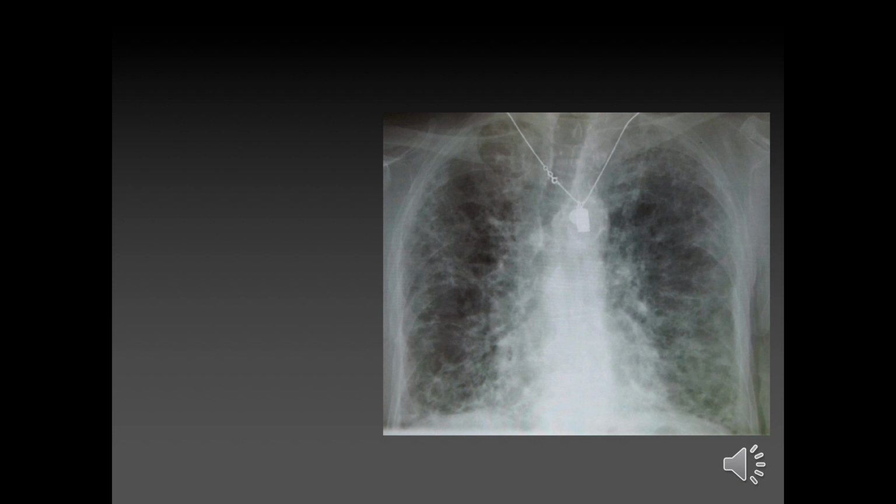Okay. So, type of film, AP or PA? What was that? Yeah, so it's PA. So you can see the scapula here, but they are kind of out of the way. Is it rotated? No. Is inspiration adequate? Again, I don't think you can actually see the ribs on yours, but I counted 1, 2, 3. So I count 6. And generally, if you eyeball it, you can tell that that's well inspired.